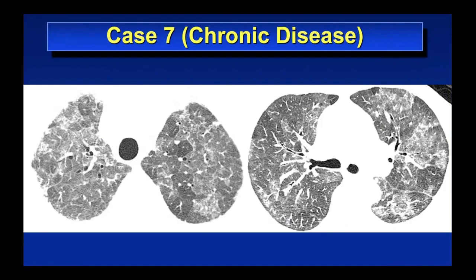And then if there's honeycombing, that's called the end stage head cheese sign for honeycombing in the setting of hypersensitivity pneumonitis. Usually, if we can catch hypersensitivity pneumonitis before it's too chronic, before it starts to get fibrotic, then if we remove the inciting factor and treat the patient, then often these findings can go away and the patient can get better.